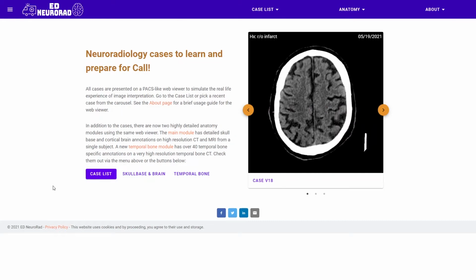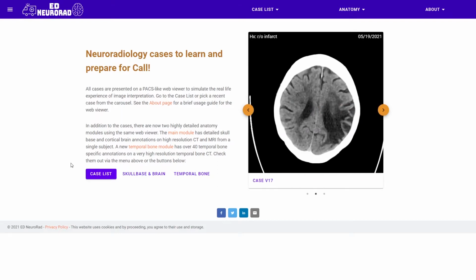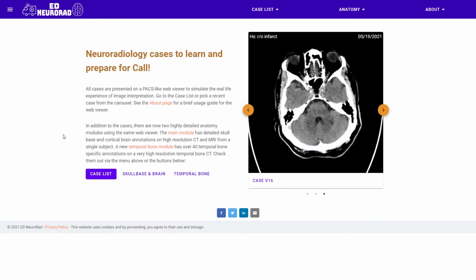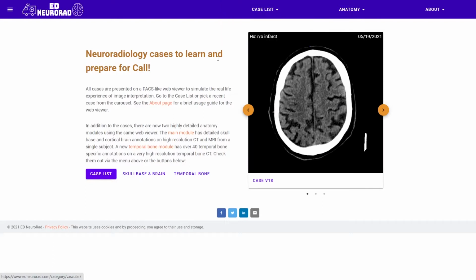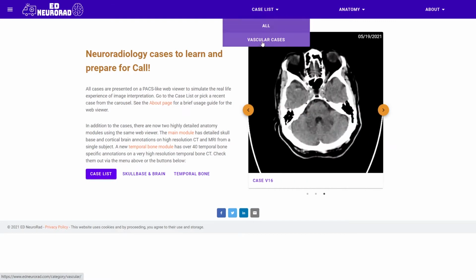I'm going to be giving a quick overview of the contents of the website as well as how to use the web viewer as it relates to the cases as well as the anatomy modules. So basically the website has two separate parts: a case list that are going to be a series of cases with an ED and on-call flavor that you can use to prepare for call, as well as at the moment two anatomy modules. Cases, I've sort of for now just separated them to all or vascular cases.